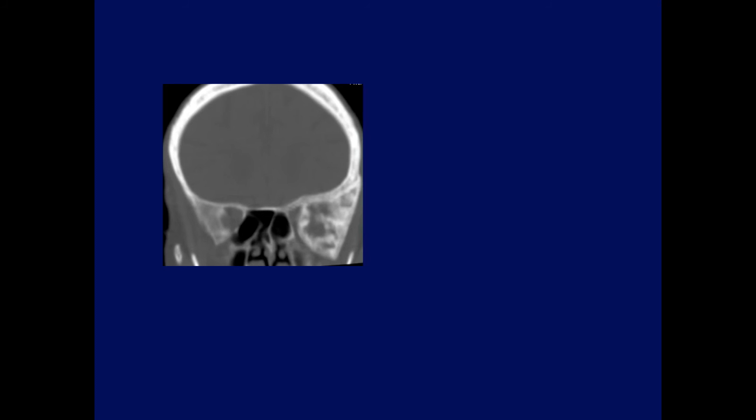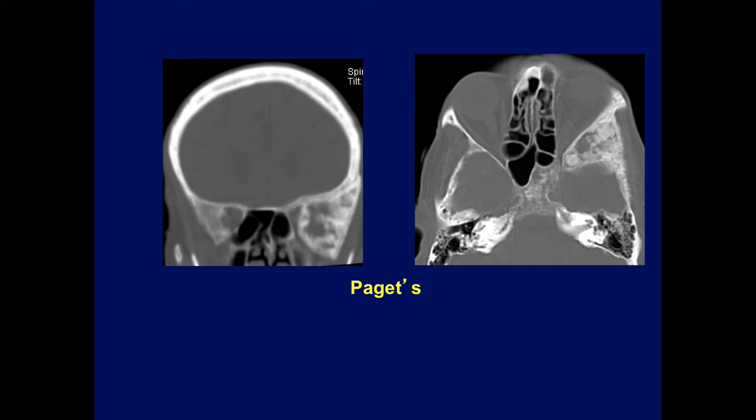What about this condition? People mentioned fibrous dysplasia or Paget's. I must say, I sometimes have trouble distinguishing the two. We thought it was Paget, but I agree. There's involvement here of the body of the sphenoid. I think either one of them may be okay. Maybe it's more fibrous dysplasia.